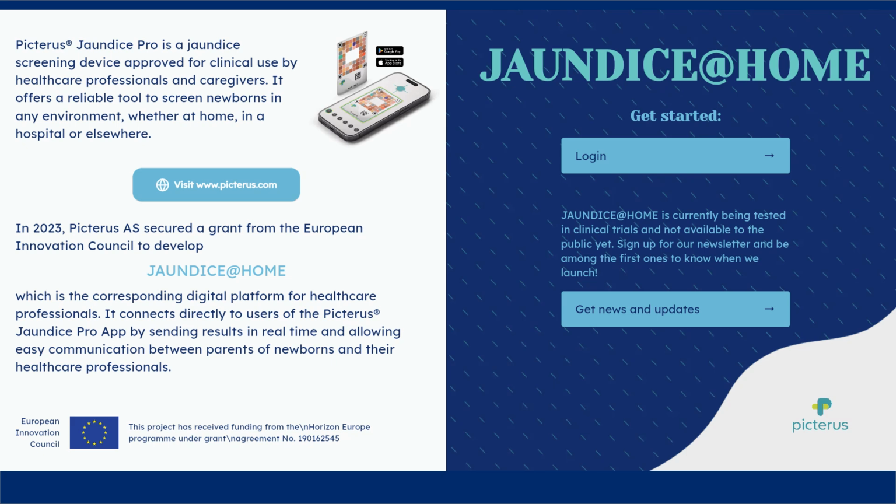First off, you need to log in to the Jaundice at Home platform. You'll receive an invitation to join your organisation from an administrator, or contact Picterus directly if you would like to create an independent Jaundice at Home account. Follow the login instructions to access the Jaundice at Home platform.